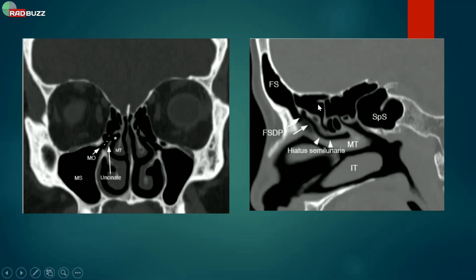Here, these are the ethmoid air cells. These are likely the posterior ones, these are the anterior ones, and that's the sphenoid sinus. What happens is the anterior ethmoid sinuses drain into this hiatus semilunaris from this pathway. The frontals are going from this one, and how the maxillary drains I will show you in this picture. So the hiatus semilunaris is draining this one, and the maxillary on the corners I will show you.